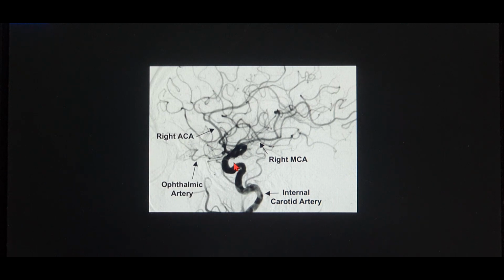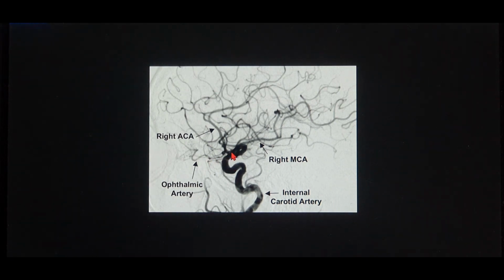This is also yet another photograph of the ophthalmic artery right there. That's the anterior cerebral artery. Now remember, the anterior cerebral arteries go upwards and anterior and then suddenly divide and branch off posteriorly along the corpus callosum to form the A3, A4 and A5. This is the MCA. The MCA divides into M1, M2, M3 and M4.